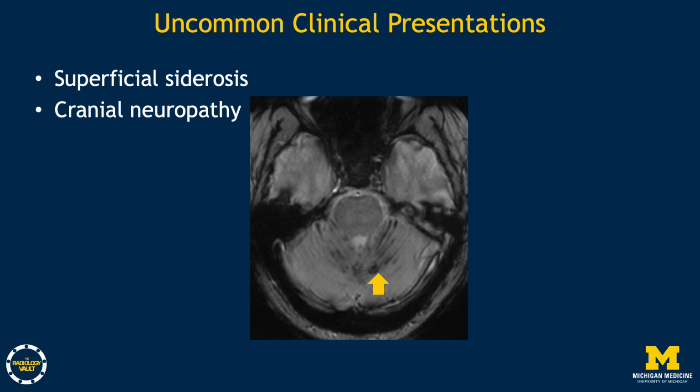Presence of superficial siderosis, as shown here on a gradient echo T2 weighted image, in absence of any other identifiable cause, should prompt a consideration of spontaneous intracranial hypotension.